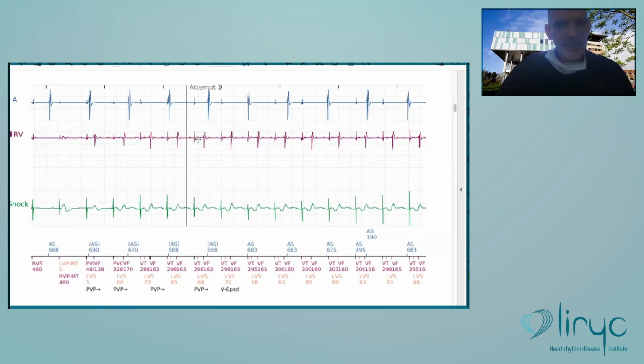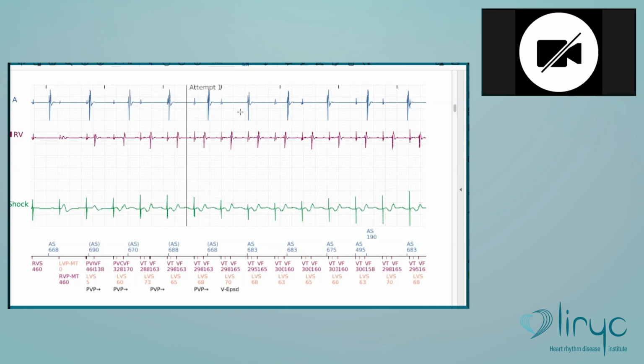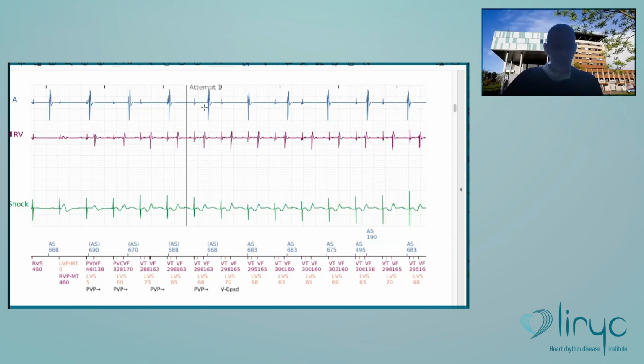It could also be P-wave oversensing, but now, if you have a look at the atrial signals, what do you see? If you look at the real atrial signals, the P wave, you agree it would be this one? So now if you look carefully, what you see on the right ventricular channel is not timed with it. There is no alignment here. So I don't think that there is oversensing of this signal on this channel.